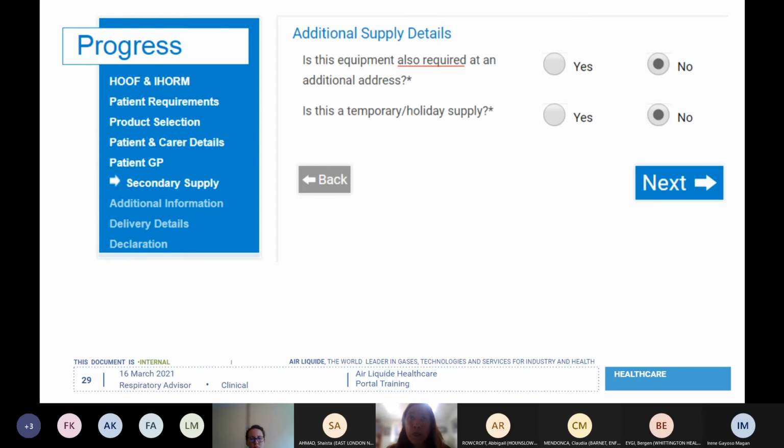All right. There is an option to put in the start date and the discharge and end date so that we can remove the equipment. Every time we create a new account, we give the patient what we call a P number. That further anonymizes the patient's data, because it's easy to trace an NHS number, whereas it's less easy if you have what we call a P number.